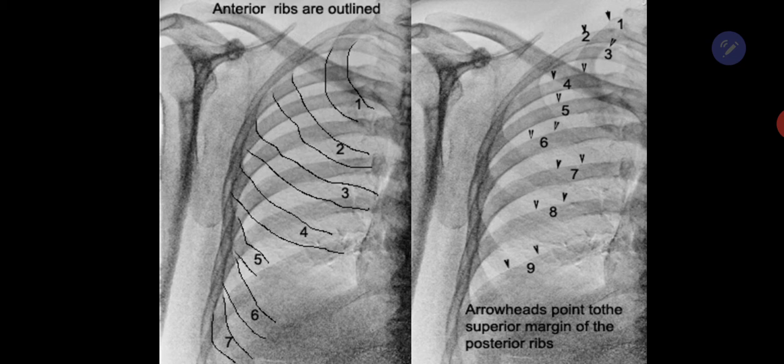And now, how we can comment on the ribs seen in images.